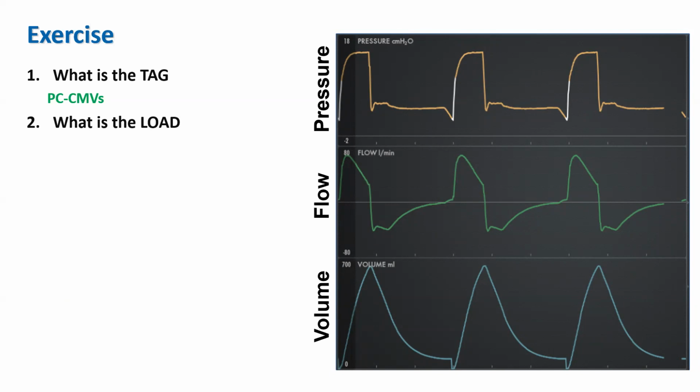Although, this looks kind of funny, right? So we could say it's probably normal lung mechanics, but we do see a patient-ventilator interaction problem. We see a synchrony problem. What would that be? What happens when you see this clipping over here? Well, we have a normal trigger on the trigger phase.